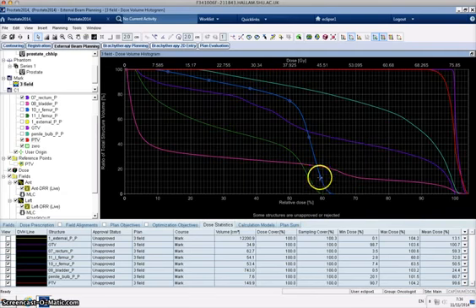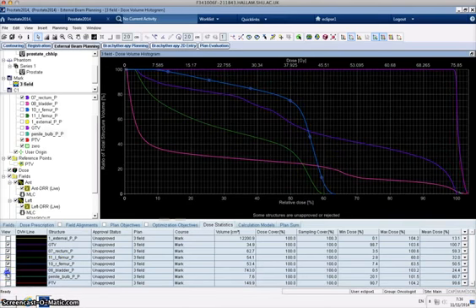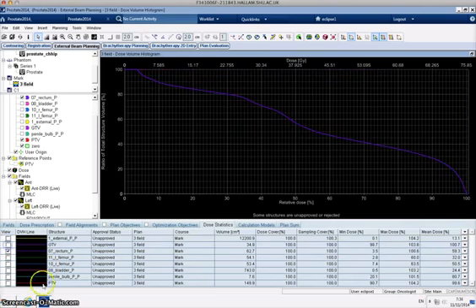Ideally what we want is our GTV and PTV, our target structures, to as much as possible be at this 100%, the high dose region, and then 95, and then drop off really steeply with the small tail, which then tells us that we don't have any hotspots. And then our organs at risk, ideally we want to drop off as quickly as we can, and that would tell us that we're not delivering a lot of dose to the organs at risk. So for the purposes of this video, I'm just going to look up my rectum, and then I'll leave you to have a think about how you would look up the other structures.